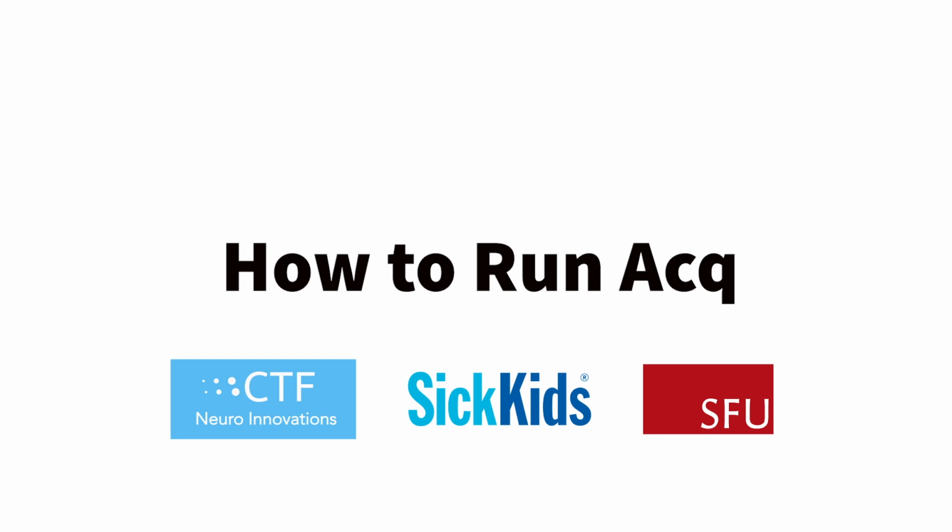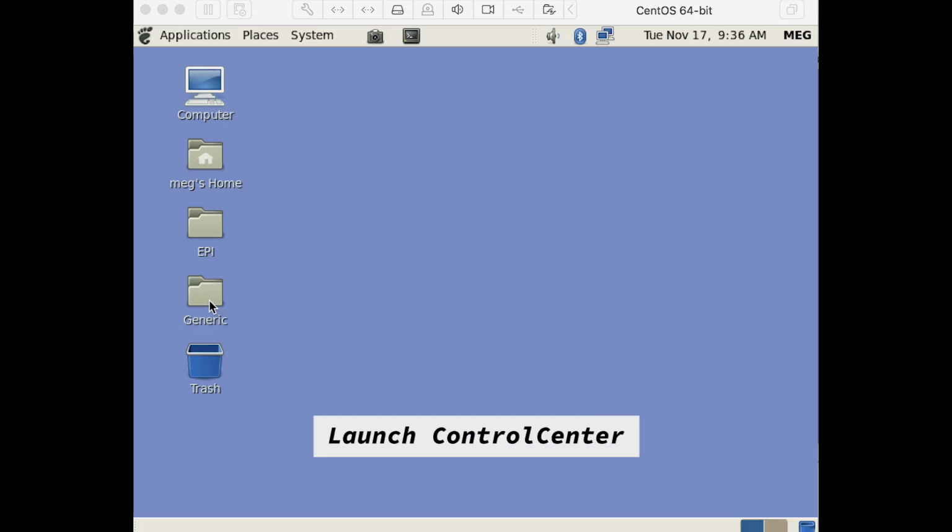This video will show you how to run the ACQ program. Begin by launching the Control Center. There are several ways to launch the Control Center.